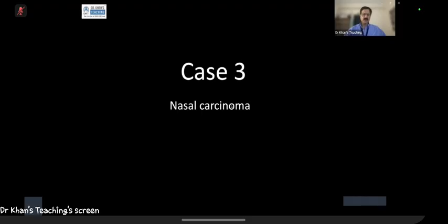You see, in some polyposis, even if you see enhancement, what happens at times is there is trapped fluid inside the polyposis, and at the edge you might see some enhancement, which is normal mucosa. Otherwise, there is no concept of polyposis enhancing like a solid mass. So you should be confident in calling it a nasal carcinoma. It was malignant by any criteria.